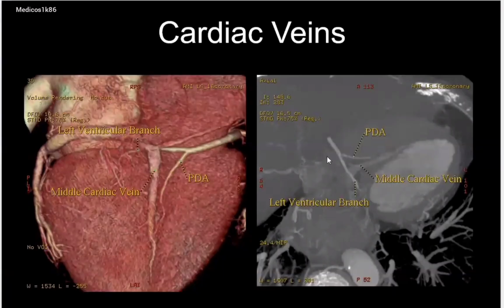This is the coronary arteries as a tree. When we remove the cardiac tissue, RCA and PDA and PLB are here, diagonal vessels, and the ramus intermedius, and the marginal branch. CX is going to the posterior part, and the left main artery, and this is the aorta. And there is some septal vessel coming, and there is the acute marginal leaving from the RCA. All vessels you can see in one shot, but it's not easy to understand because of the orientation.